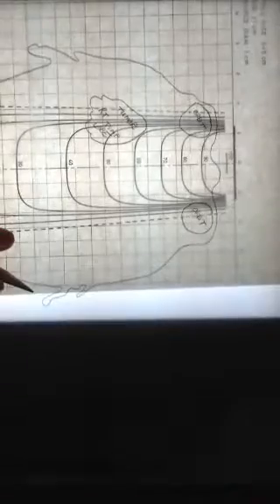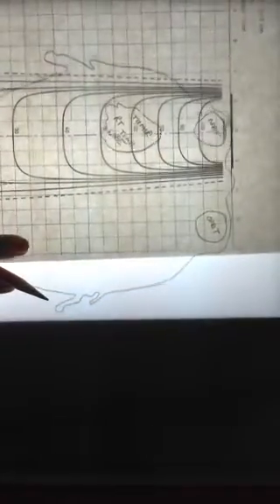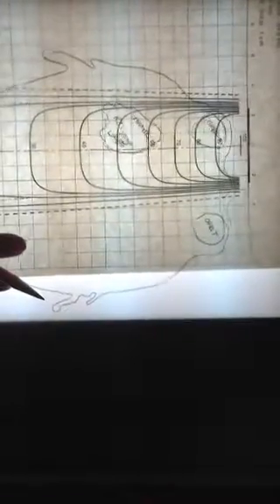So on our contour, which is not flat, we're going to demonstrate the shift technique, and we're going to use the 2/3 shift. That's a principle that says that dose lines are going to shift 2/3 of the way when you are using a low energy beam like cobalt. I have a light box here, which makes it easy for us to see. I'm going to choose a location to put my beam on. This could be any location. In this patient, I'm coming from the AP view.